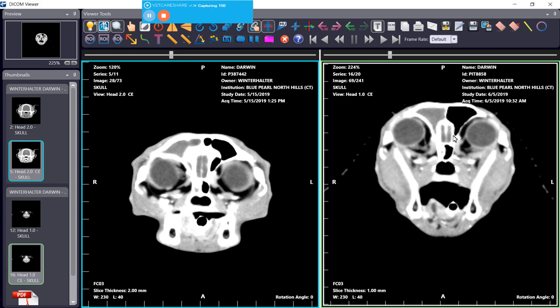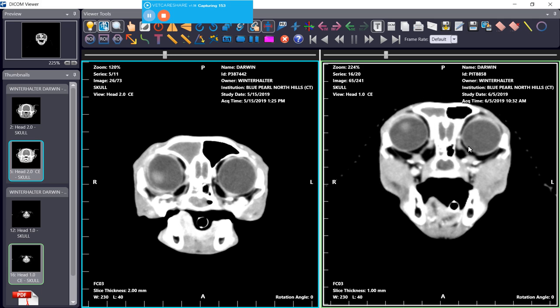So right here centrally, if we move forward a little bit, this butterfly shape is actually his brain centrally, and this is the bone that surrounds the brain that's between the nasal cavity and the brain cavity. So I want to point out a couple of changes. It's evident on both the pre and the scans from today, but this is fluid in the frontal sinus. We will treat that as potential tumor tissue if we move forward with radiation therapy. And this is fluid and or mass in what's called the retropharyngeal area. So we're back beyond the mouth, kind of where the post-nasal drip would occur, is right in that area.